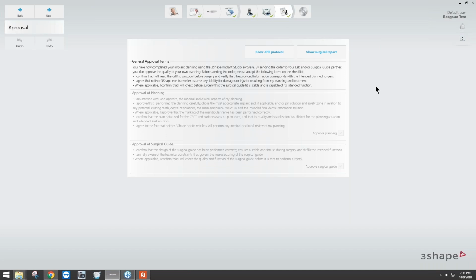Right now, at least, there is a way to get around this by making a copy of the case, and it does unlock the copy. Just make sure that after making changes, you get a new report signed off on. Afterwards, I can continue next.